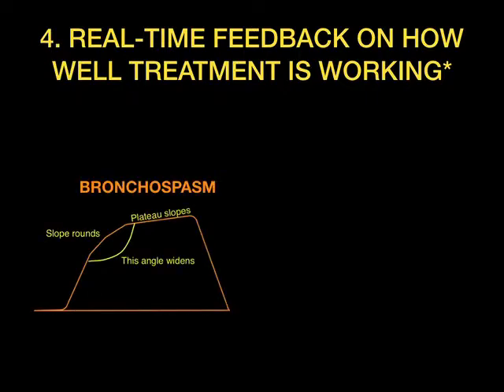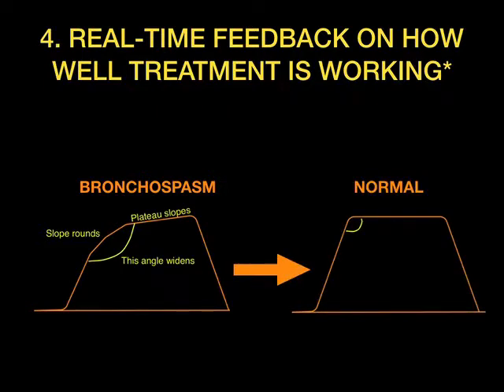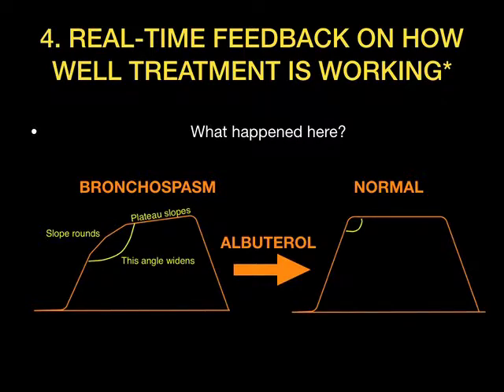The next point is that end-tidal CO2 will give us real-time feedback on how well our treatment is working. So let's say again we have our patient with bronchospasm. And then after some time, they go back to normal. What happened here? Well, clearly we gave a treatment of albuterol, and we can see the effects of albuterol on our treatment to alleviate bronchospasm. We can also see how well our treatment is working with airway.